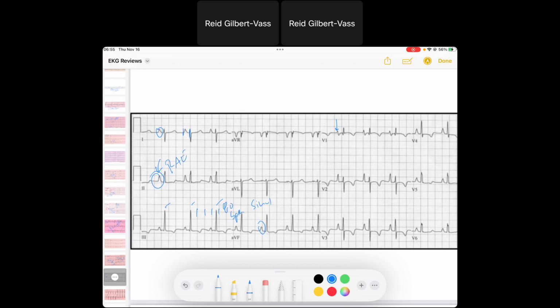And so we know right atrial enlargement is best characterized by the right atrial portion of depolarization, which is usually going more down and to the left, which is perfectly captured by lead 2. We also have for our QRS a downgoing QRS in lead 1, upgoing QRS in AVF, and so that would be going down and to the right for our axis.